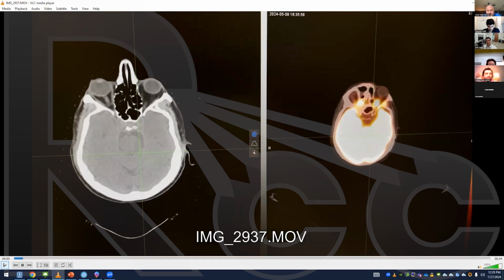So here first, again, the image fusion. I made sure to verify that everything has been fused carefully. And in a nasopharynx case, as Dr. Malik said, if it's post-induction, EBV positive, you have a lot of data sets. You have pre-chemo and post-chemo. So you want to interrogate each one of them closely for the fusion, make sure it's accurate. And you want to make sure you have multimodality imaging.